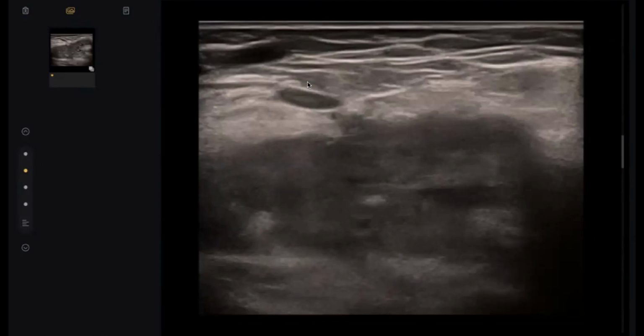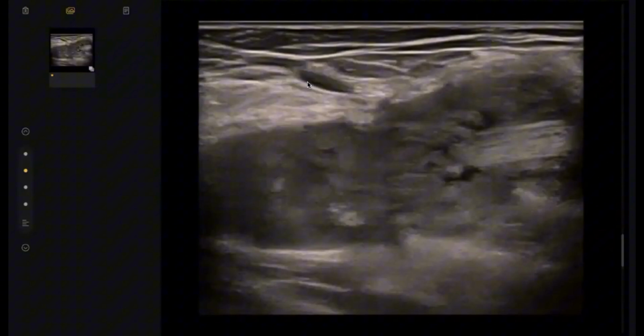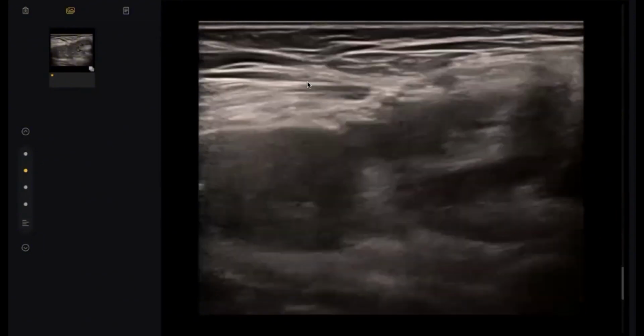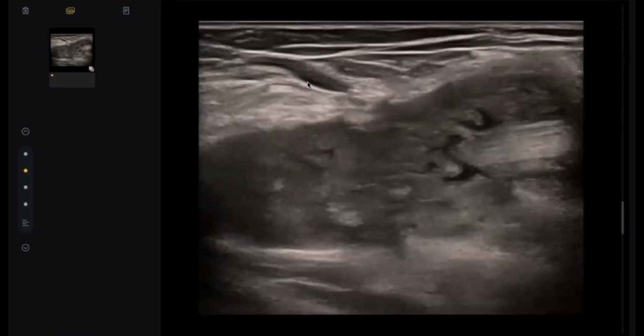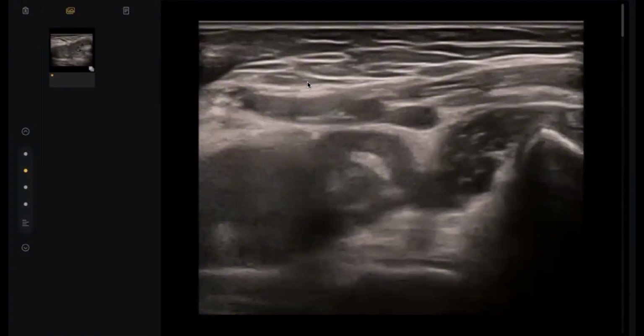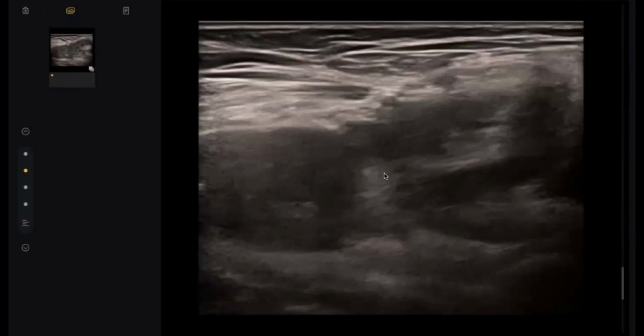Yes. Okay. So I've been presented with severe distal arm swelling. What happened here? So here I can see that there is a linear structure which is abruptly ending, and it is associated with the soft tissue swelling which is occupying the distal end. Look at this linear structure. What is this? This seems to be a nerve or a tendon. Tendon. Yeah, surrounded by a large soft tissue mass. What do you think?